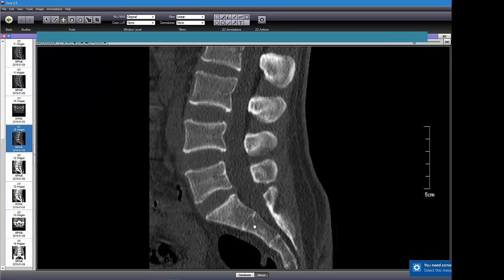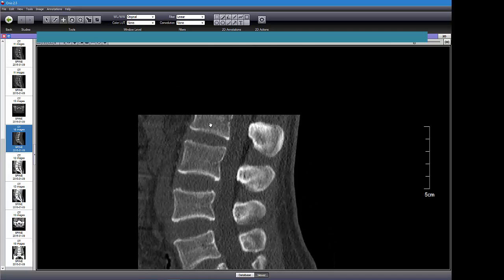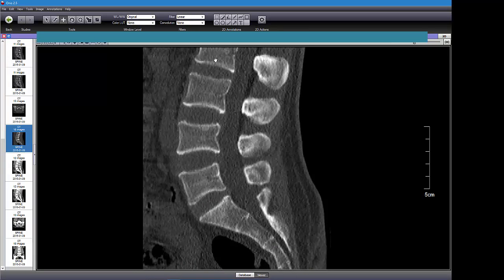Here's the sacrum. Oops, I got a little notification. Sorry about that. Windows always wants to update, doesn't it? I need to turn that off. Anyway, here's the sacrum, right? Sacral canal. It's the base of the tower. Then you have L5, L4, L3, L2. I can pull it down. Oh, I can't. That's as high as it goes.